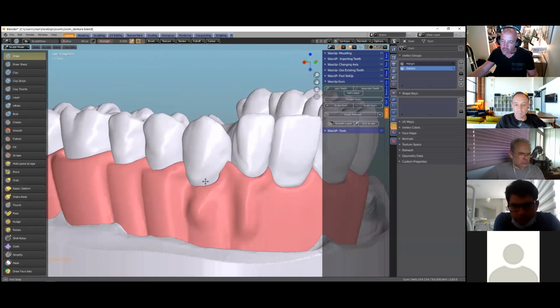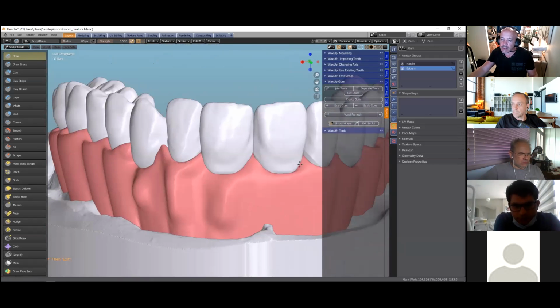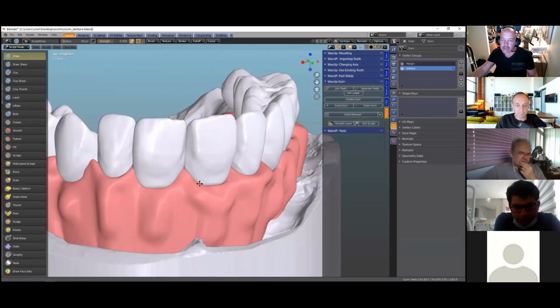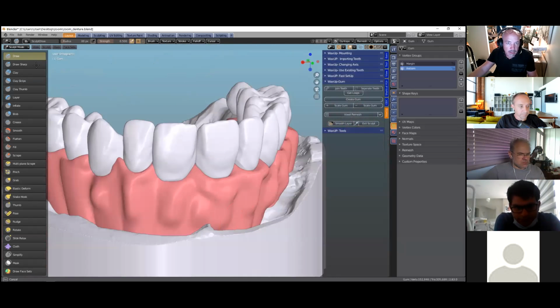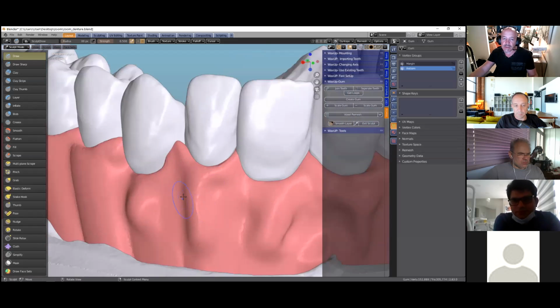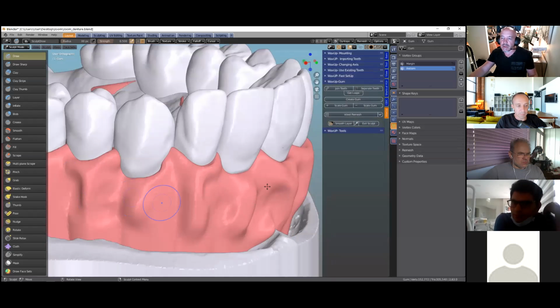So I'll just quickly do a little bit so that you guys can see what we can do. Okay, over there we can just put a bit of a, and then we got the minus and the pluses. We can, so we got lots, we can do a lot of things here on our little denture.